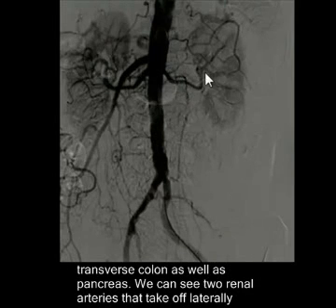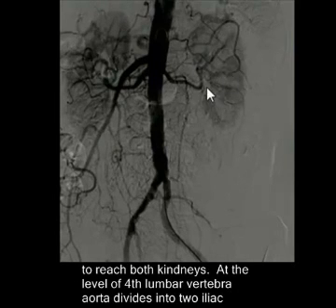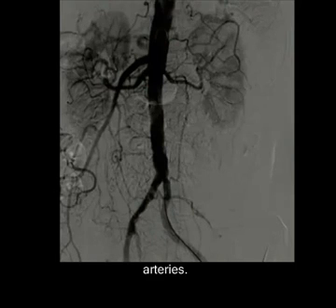And also you can see two renal arteries coming out of the abdominal aorta that supply oxygenated blood to the kidneys. The aorta is dividing into two iliac branches at the level of the fourth lumbar vertebra. So it is just one big vessel which is giving off small branches. It divides into two at the level of the fourth lumbar vertebra.